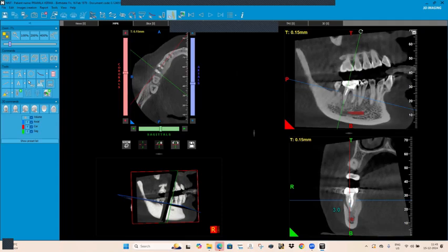We cannot have a 3-dimensional volume, because a lot of studies demand, the PG students demand, before and after biomechanical preparation, what is the change in the volume, and which file system cuts the canal more. So there are a lot of queries about that in my institute. I'm curious if you have any tool where you can measure the volume of the pulp pre-operative and post-operative.